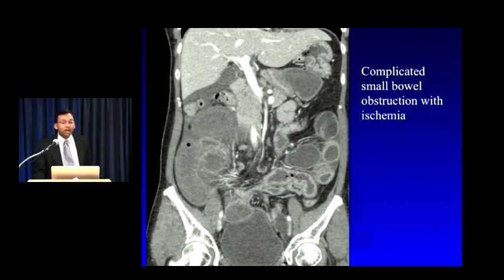And so there is a lot of overlap in terms of what you can see in any given case. Remember, you're strangulating both the arterial and the venous blood supply. So as in this case, some bowel loops may be abnormally hypoenhancing without a lot of wall thickening, especially in this case, the bowel loops in the right hemiabdomen, whereas other loops may look more like a venous ischemia. They're thickened, hyperemic, as the loops in this case are in the left lower quadrant.